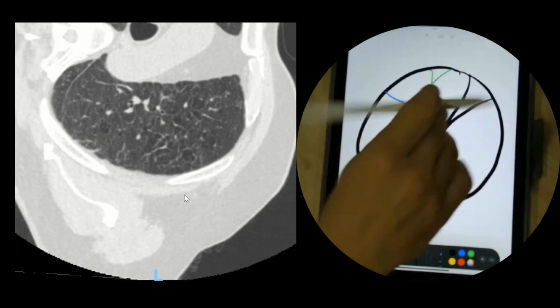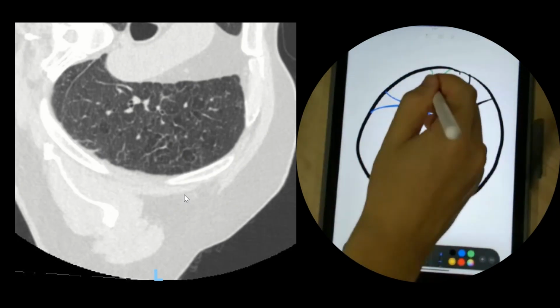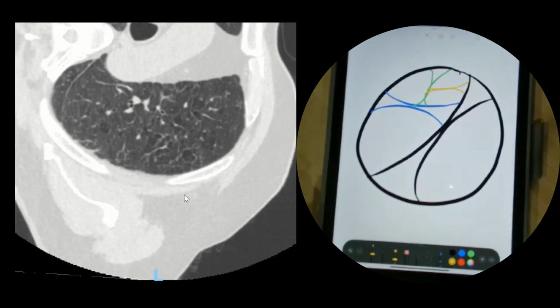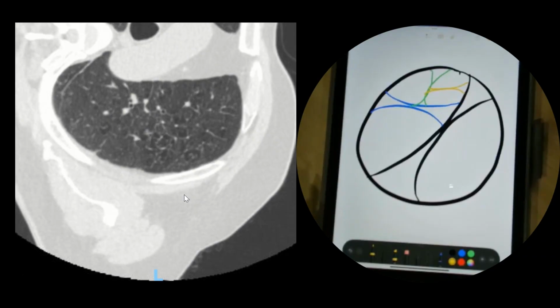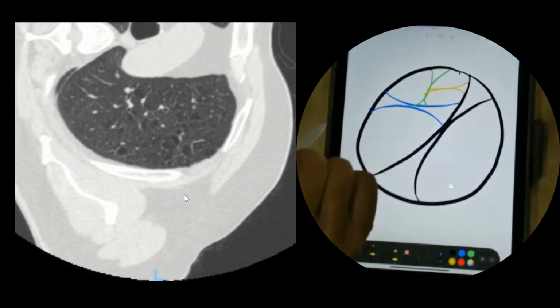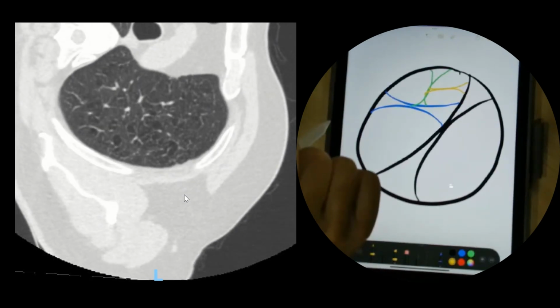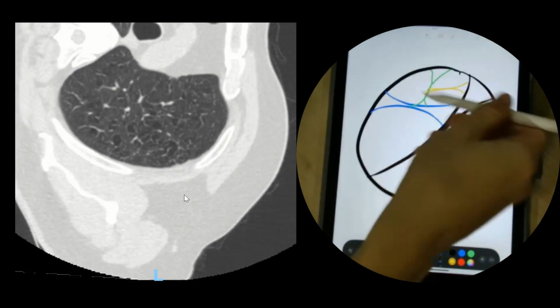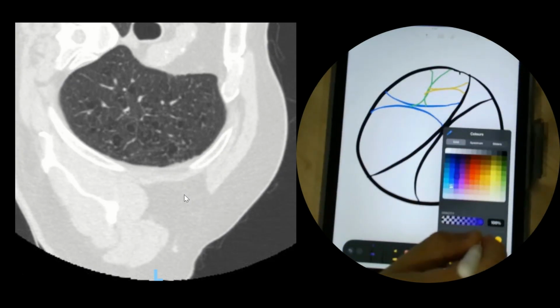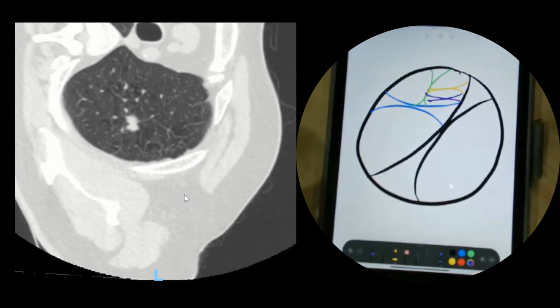Following the right hole, we see that it splits up and down at this angle, and we draw it like this. Now following the down hole, you may need to enlarge your screen to see this, but here we see that it splits again, up and down. Like so.